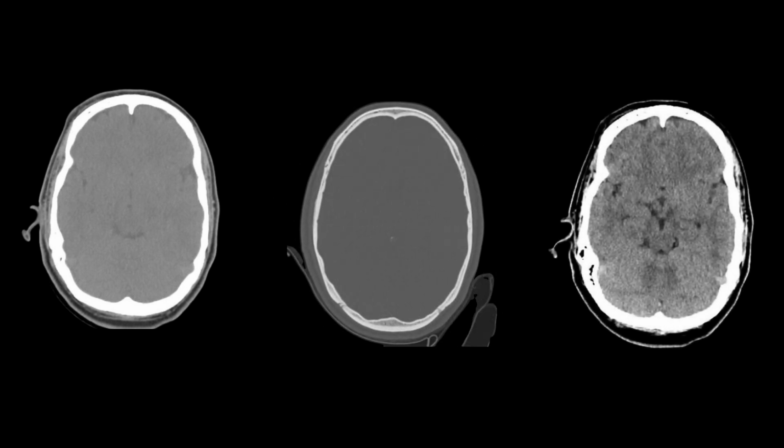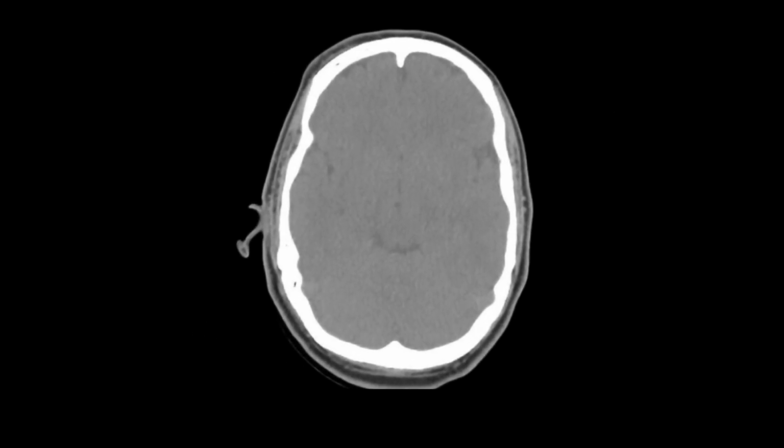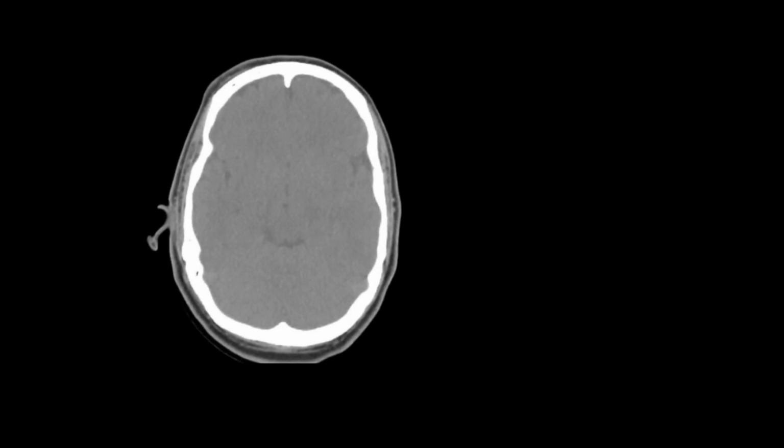So this is an example of CT brain windows. The CT can focus on either soft tissues, bone, or the brain. On the far left, the one focused on now, this is a soft tissue window. You can clearly see there is not a lot of information about the brain evident in this image, but you can clearly see a lot of the soft tissue. Soft tissue of the scalp is seen clearly here. I'm moving over it with my cursor in the spotlight, and you can even see the ear pinna right here. Brain, not too much information.